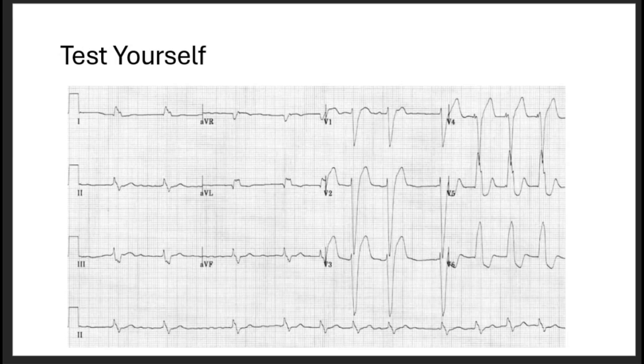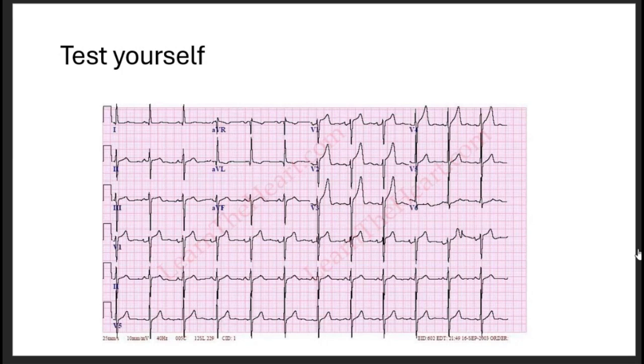I'll give you again 2 minutes for this one to see which type of block this is.